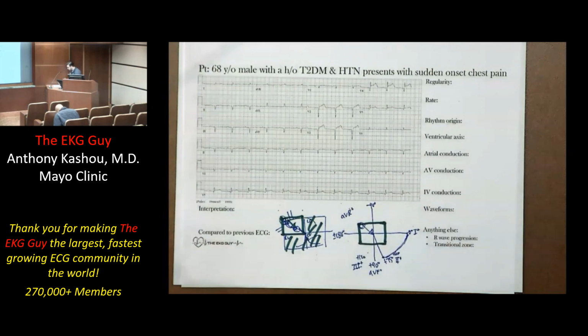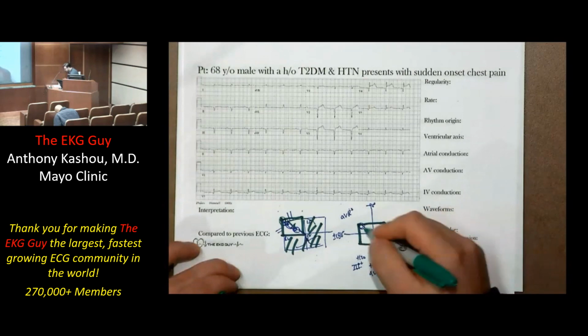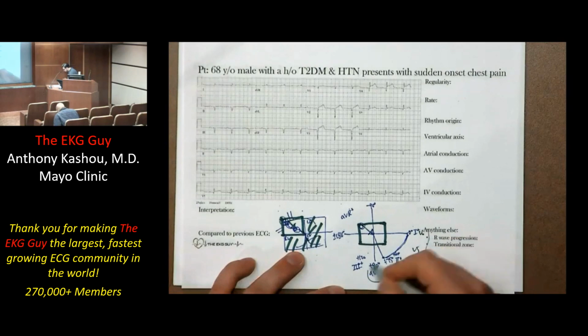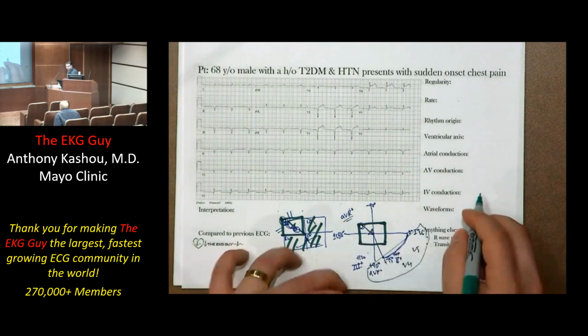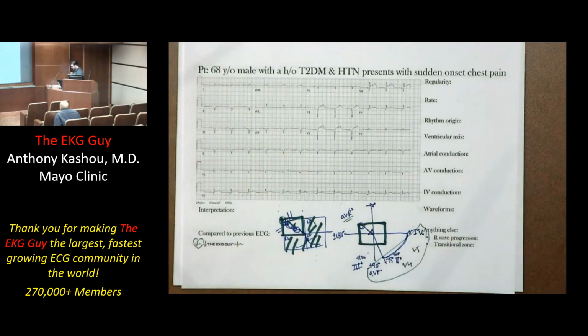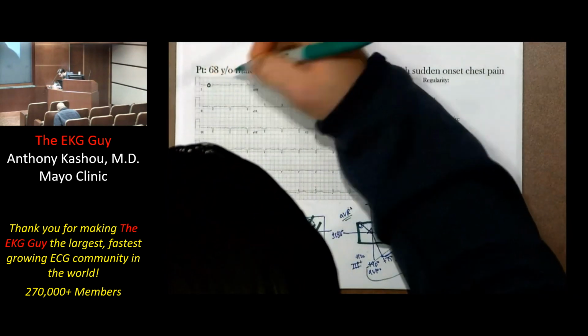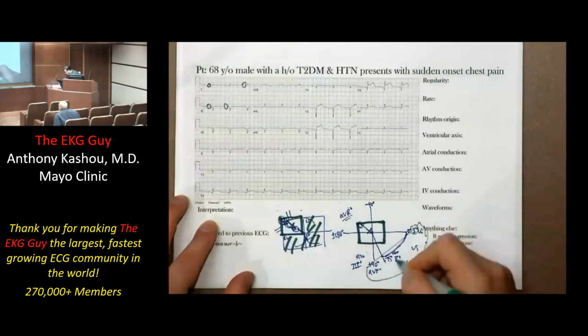And then in the horizontal plane, we also have some leads here where we have V4, V5, and V6. So our vector is heading in this direction towards that, meaning that these leads here should have positive upright complexes. It's going away from AVR, so we should see negative P waves in that lead. All right, so far so good. So if we look at our EKG here, we have our patient here. We should see upright complexes in, we said, lead 1. And you can see them there. They're small, but they're even more evident in lead 2. So we said 1, we said 2.